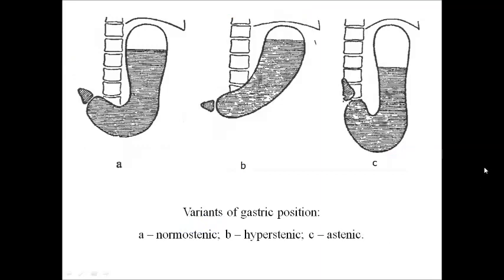What about the stomach? First of all, its size and position vary depending on the constitution of the patient. Here are variants of gastric position.